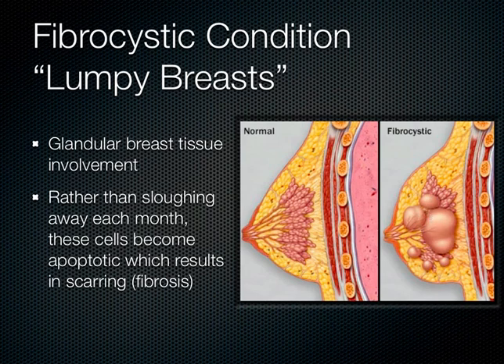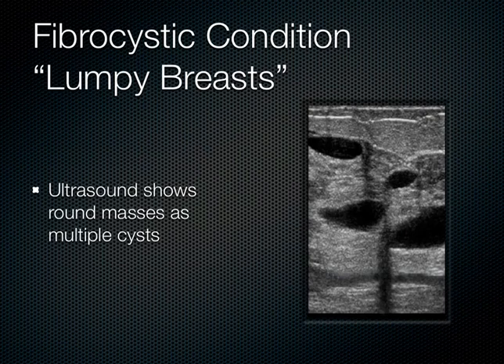And on ultrasound, this is what it looks like, just multiple cysts everywhere. And you can notice on the edges of these cysts there's these shadows that come down. And there's another one here. And basically that's something called refraction artifact.